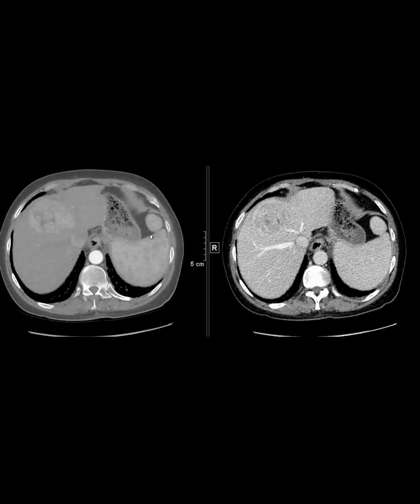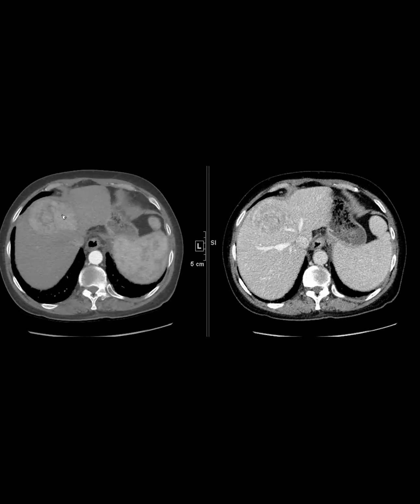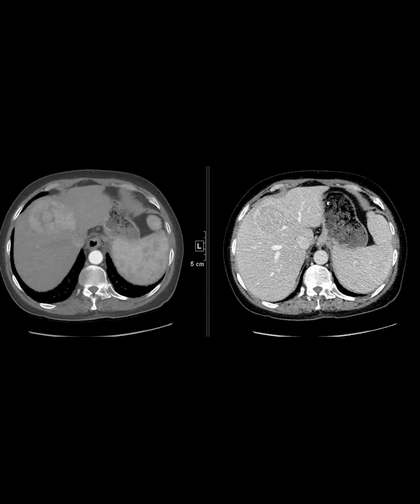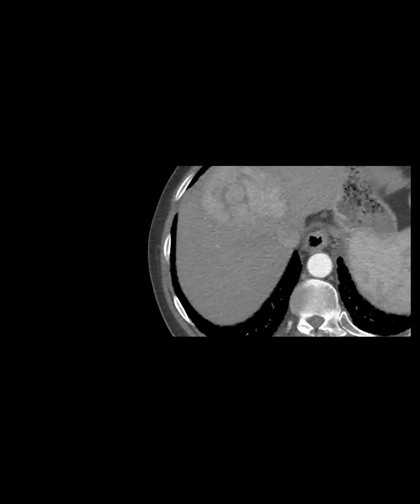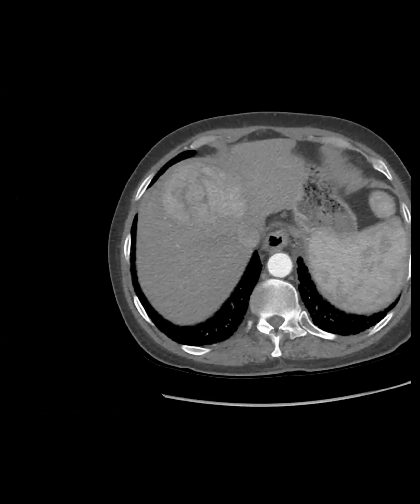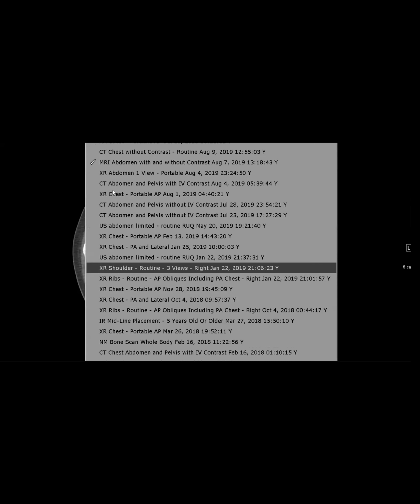So this patient had chronic Hep B infection, came in with this fairly classic HCC, arterial phase hyperenhancement, washout appearance, a little bit of a capsule. So for whatever reason, patient didn't feel like getting treated, and then they were lost to follow-up and came back. Let me just figure out how many years later. They came back a year and a half later.